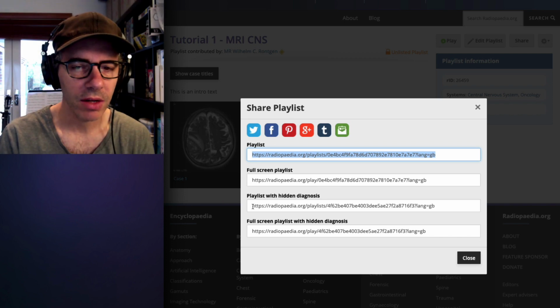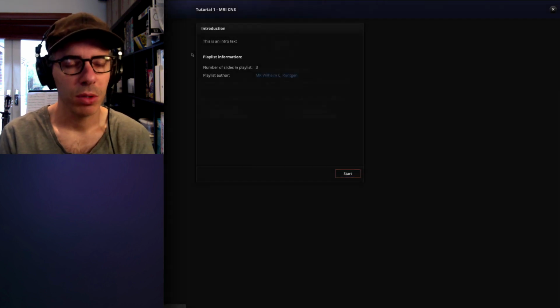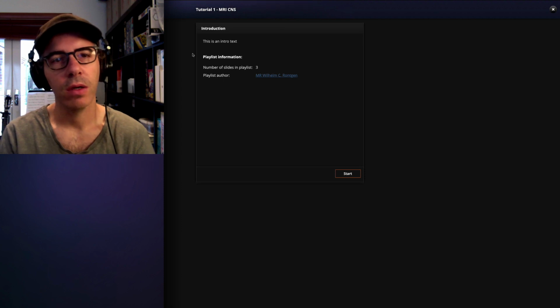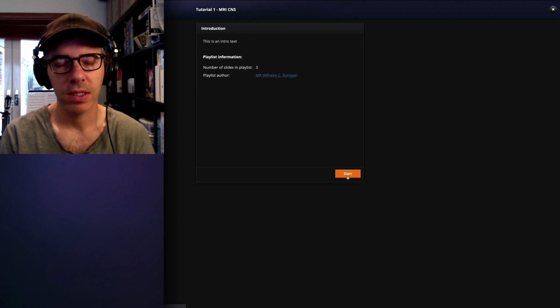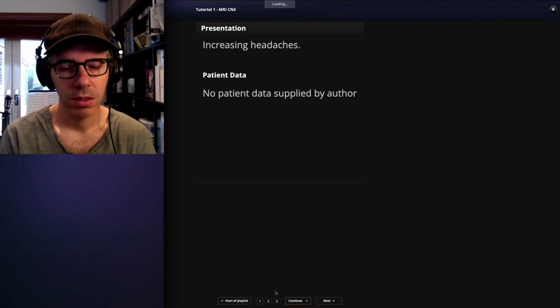If you want to share it ahead of time, then I would recommend sharing with a hidden diagnosis. So if we take this URL, open up a new tab, here we are in our shared playlist. It looks exactly the same, and it will have the presentation and it will have the cases.